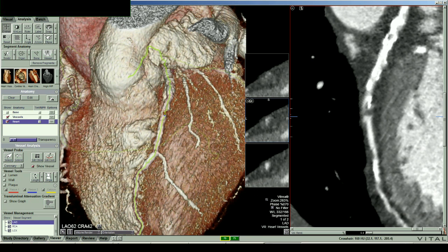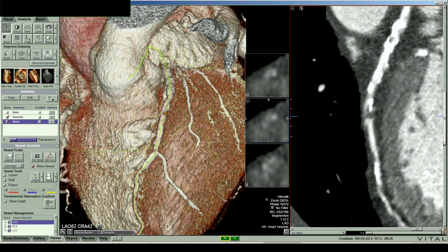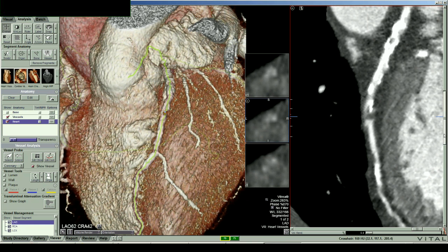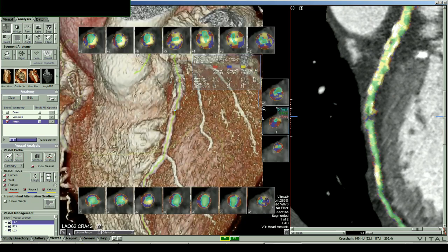And looking inside here, I don't see any contrast at all. So where we used to have that little bridge of contrast that was separating, I see right here that there's no contrast at all where it used to be. And so now if we apply the vessel tools for colorizing stuff, it will always make a little lumen, and it will make a very, very tiny little lumen.